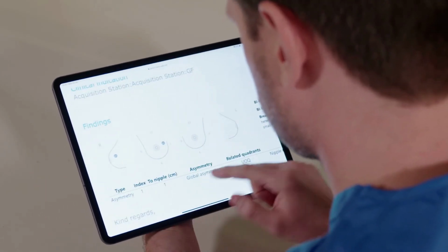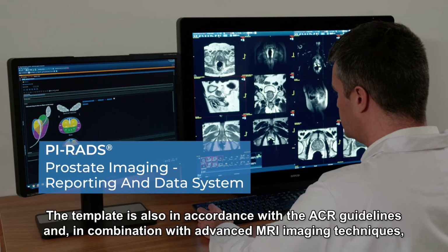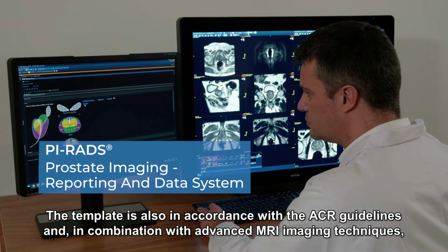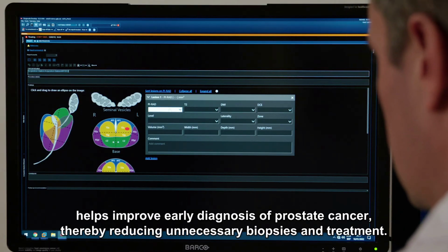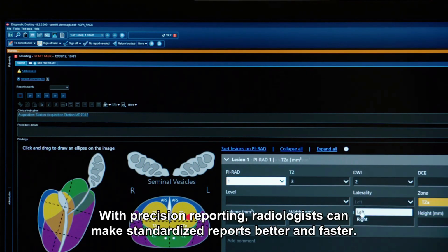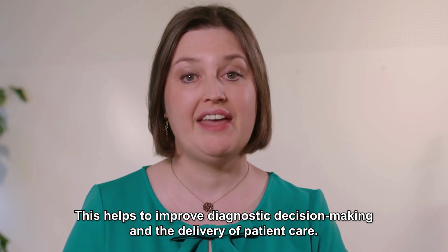scientific research. The other default template is used for prostate reporting. The template is also in accordance with the ACR guidelines and in combination with advanced MRI imaging techniques helps improve early diagnosis of prostate cancer, thereby reducing unnecessary biopsies and treatment. With precision reporting, radiologists can make standardized reports better and faster. This helps to improve diagnostic decision-making and the delivery of patient care.